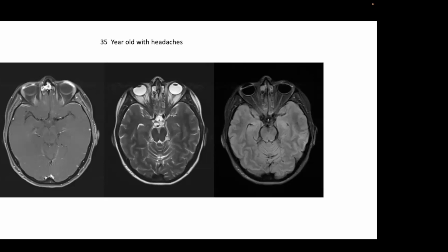That's a good thought. You get the feeling that the eyes are distorted, right? It looks like it's squashed a little bit. And you'll see this dark band and a little bit of high signal there. I don't know if you can appreciate that, but that's what I see. And again, here it almost looks like a retinal detachment, but it's in the wrong side of the globe. So anyone, can you think of some reason why the eyes might look like this? Maybe these are artifacts from lens.